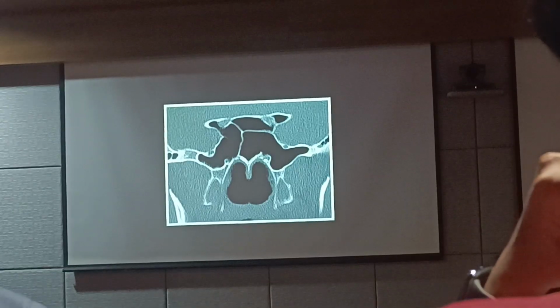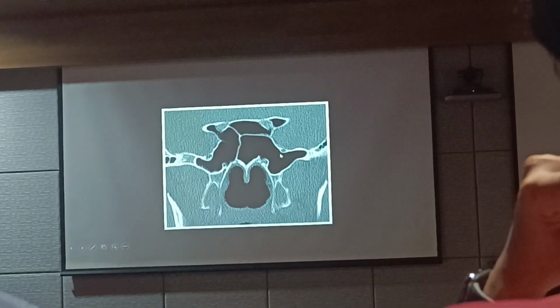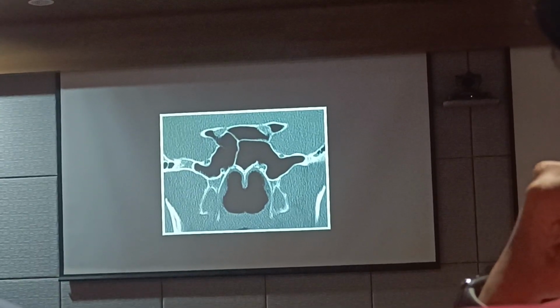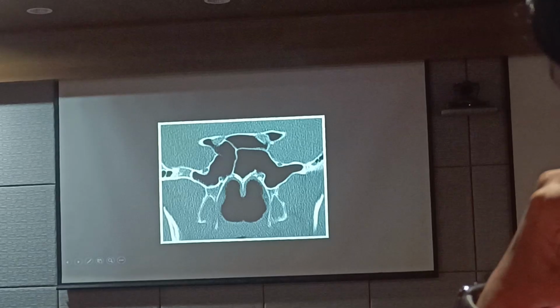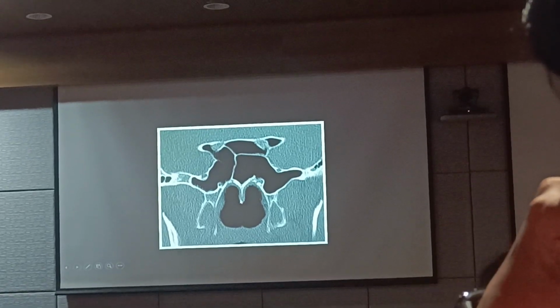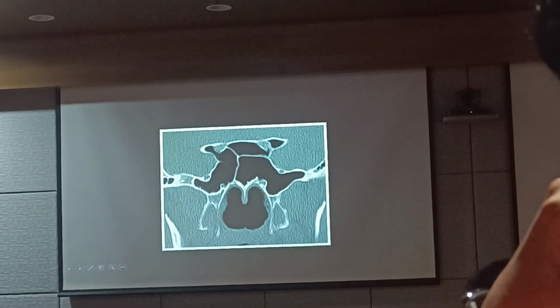As you go a little bit behind the posterior ethmoids, I've already shown you the superior turbinate. Madam showed you how the lower end of the superior turbinate uncovers, or is blocking, the sphenoid sinus ostia. Correct? So right behind your turbinate you will see a sphenoid sinus. Now you have already studied that this is the choana. Madam showed you that pretty nicely.